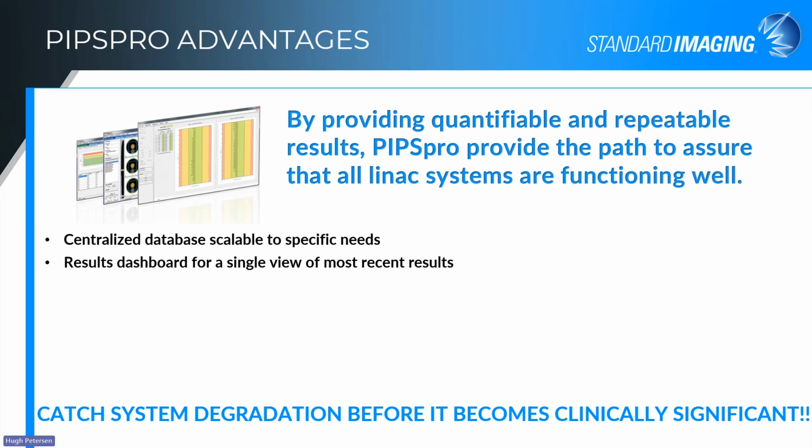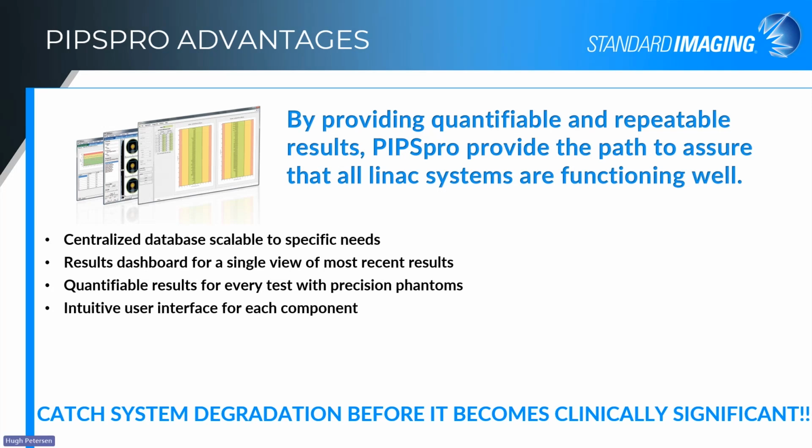The results dashboards for a quick single view of the most recent results. Quantifiable results for every test with Precision Phantoms available. We've got a Phantom package as part of the offering. Very intuitive user interface for each component. Quick, 1 or 2 clicks gets you right to where you need to be for your analysis.